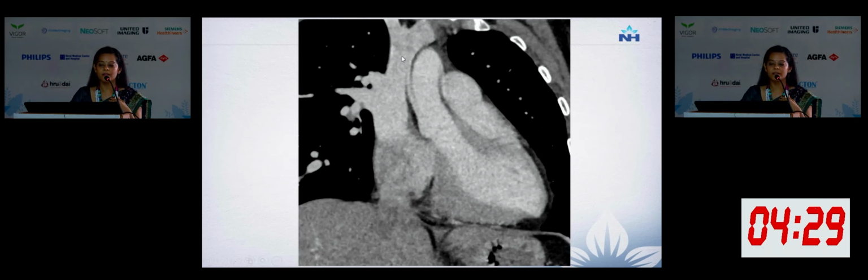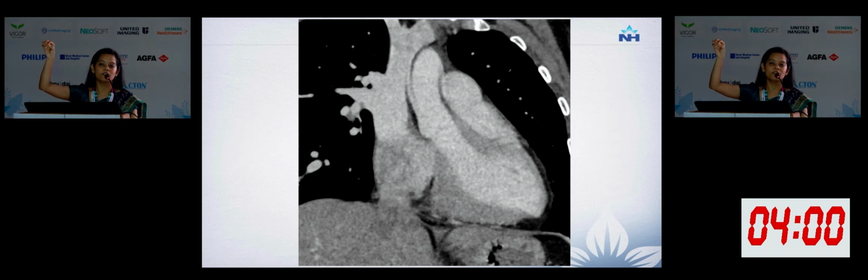This is the third case. Again, superior sinus venosus ASD with PAPVC. However, here you can see there's a separate drainage of a segmental vein, other than the lobar vein, into the SVC. What happens in such cases is, when they put the stent, this will get jailed, in the sense it will get occluded, and that will not drain. So when we are reporting this, we need to tell them that one of the segmental branches will be occluded and will not be draining.